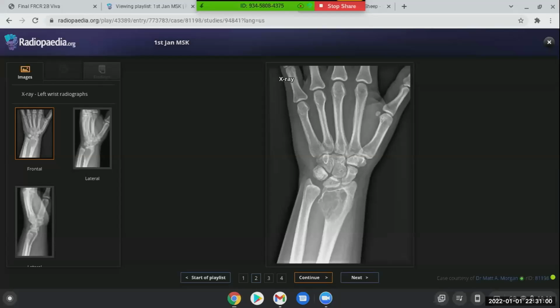However, in this case, we should see some maybe periosteal tunneling and cortical tunneling or subperiosteal erosion in the phalanges, which are not imaged here, or maybe even the carpal bones, metacarpal bones, but I don't see any of this. And also in the hyperparathyroidism, we could see some calcifications at the region of the TFC, but also this is not apparent here.